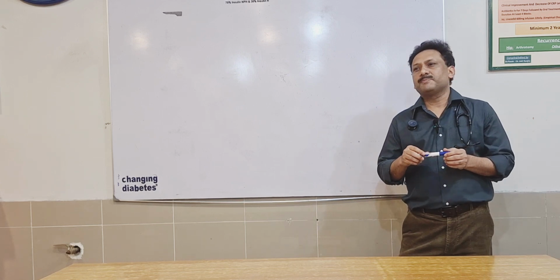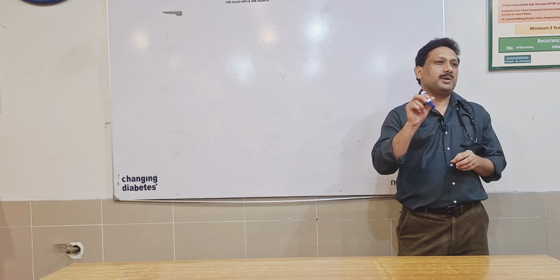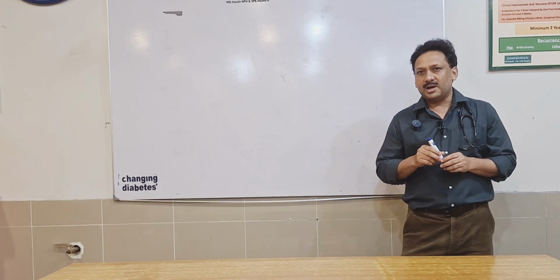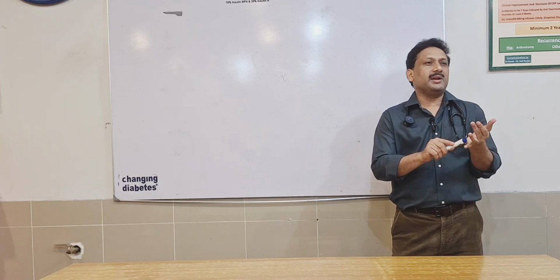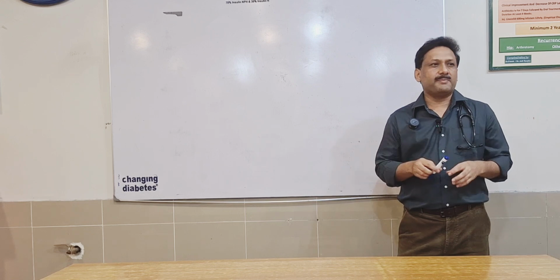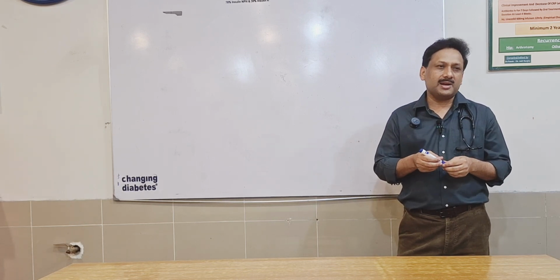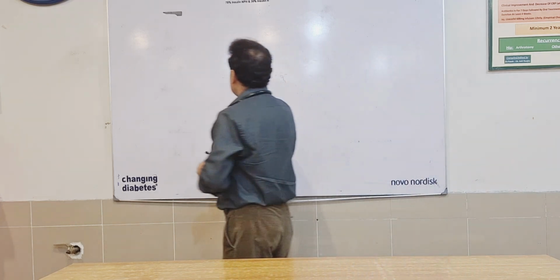And when you talk about that ECG segment, you need to focus on three things mainly, which we'll be studying in today's session. These three things are: one is ST segment, second is T wave, and third is Q wave. So these will be the abnormalities we'll be discussing in the time ahead, likely in the next 40 to 45 minutes. So we start with ST segment.